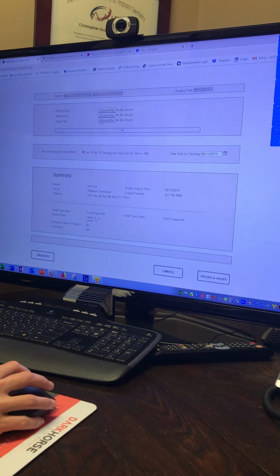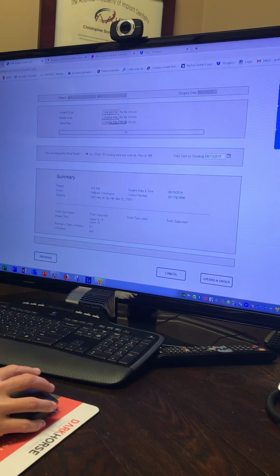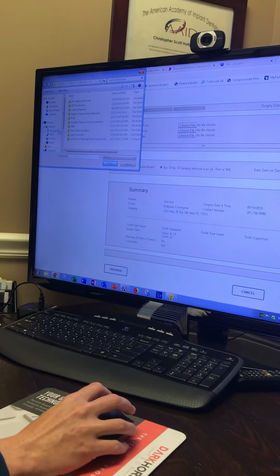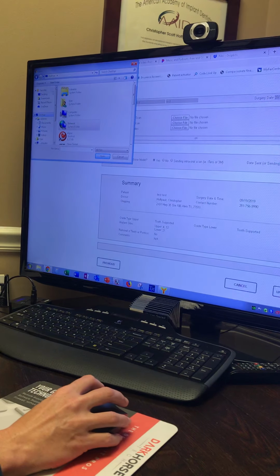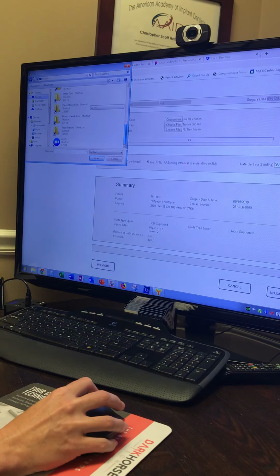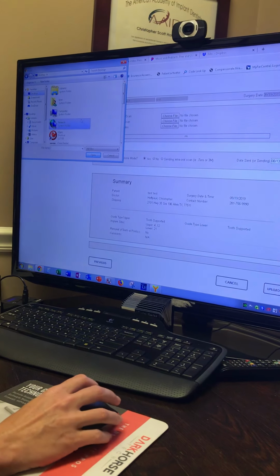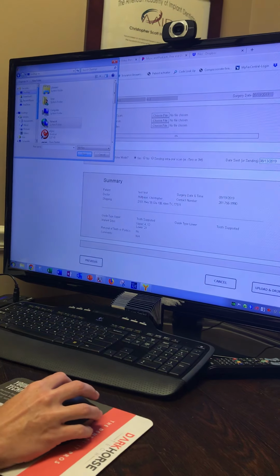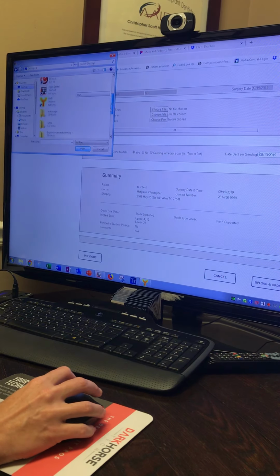Now, this is where we upload the CBCT. Okay, we'll choose a file. So we'll click there. And I'm just going to click one over here. Let me see here. We'll go desktop. We'll scroll through here. There's probably not one in here. So what you'll do, because I don't have one in there, let me see, is we will go, that way I can show you.